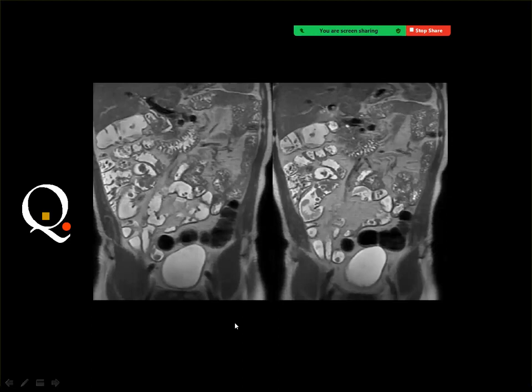Next case is a series of MR enterography. Okay, and I hope that you have listened to the lecture about the MR enterography. This is a new one I added to the contents of the course.